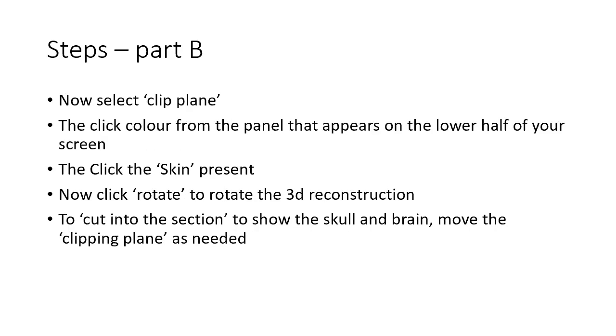So once I had the 3D reconstruction, I clicked on clip plane. Usually it's a right click, which brings up the contextual menu, and from that I chose clip plane. It allows you to clip.